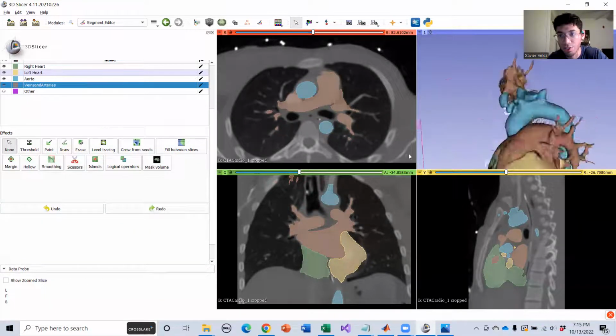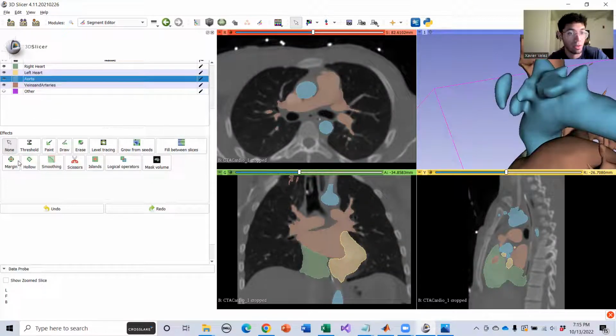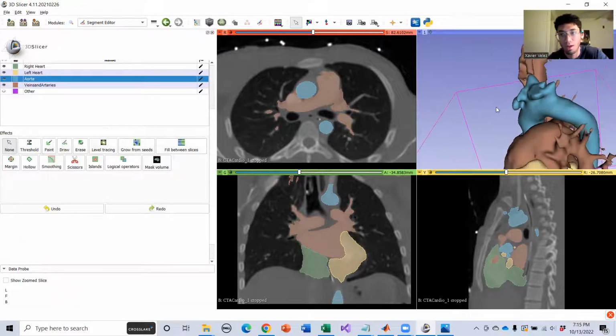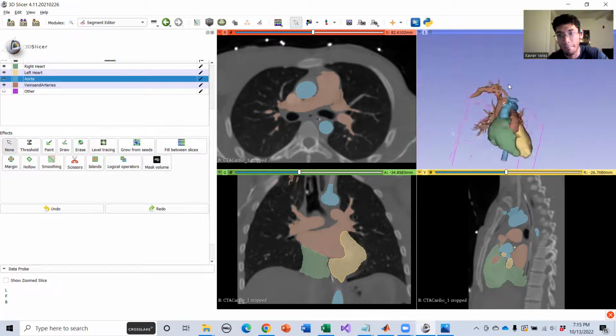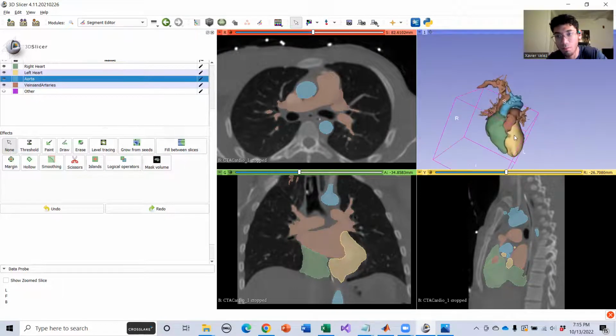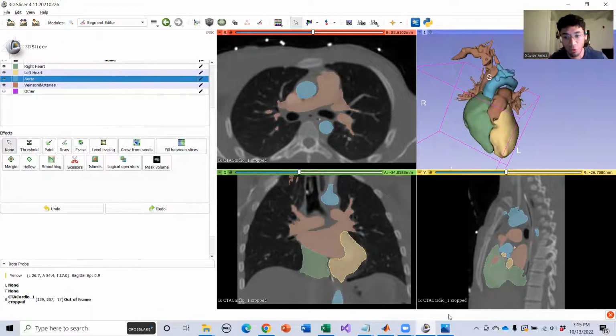And what's left is now this floating piece of the aorta. We don't like floating pieces, no matter what application or what you're doing. I would say try to never have floating pieces. Those are bad news pretty much always. So yeah. Okay, so we got our little thing. He's an ugly little heart, but you know what? He's got character. We're gonna give him a makeover though.